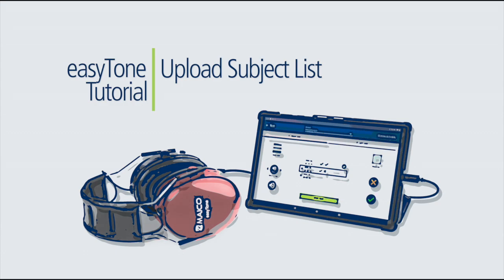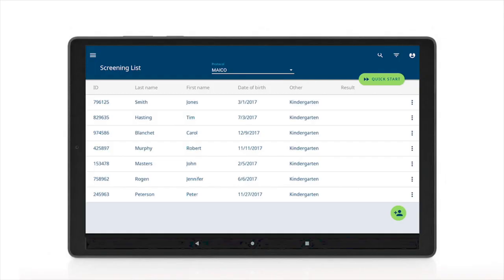This tutorial is to show how to upload a subject list to the easyTone app using the easyTone companion software. The easyTone app has the option of 5 columns to be imported for the easyTone screening list, and Other field, which is used for any general information such as grade, teacher name, or school name.